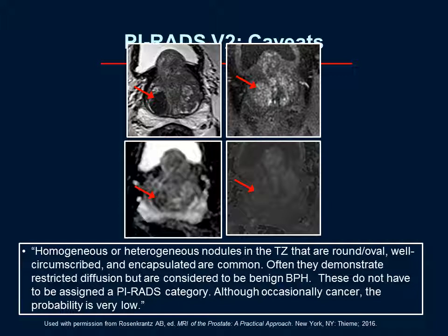And this stromal BPH nodule has fairly typical features, the rounded shape, the margins, even how it looks on the other sequences. And we recognize it as stromal BPH. We do not need to create suspicion if we try to be overly dogmatic in looking at the criteria, but can just describe this as a benign nodule.